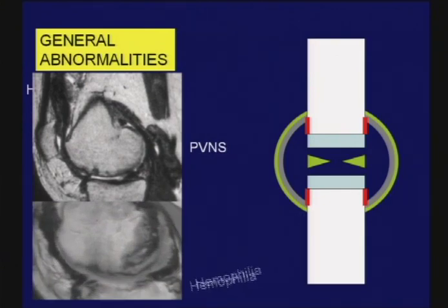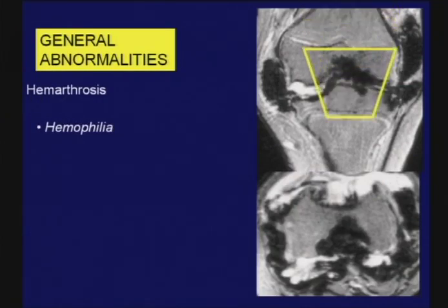Here is another young adult with polyarticular disease, and again, the major finding is the hemosiderin deposition around the joint. Best diagnosis in this case would be hemophilia. So the finding of hemosiderin deposition is not specific, but based on clinical information, you can usually narrow down the process.